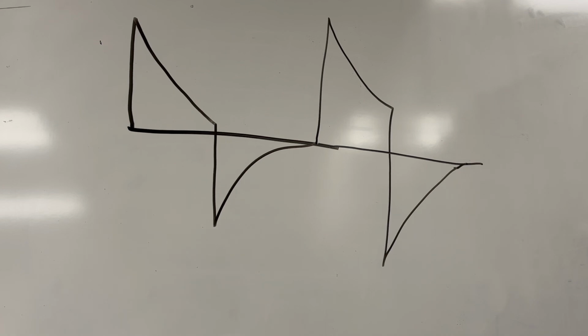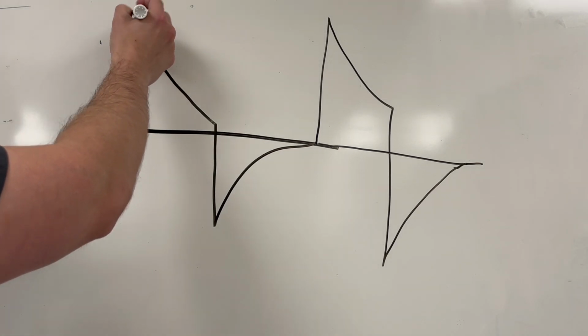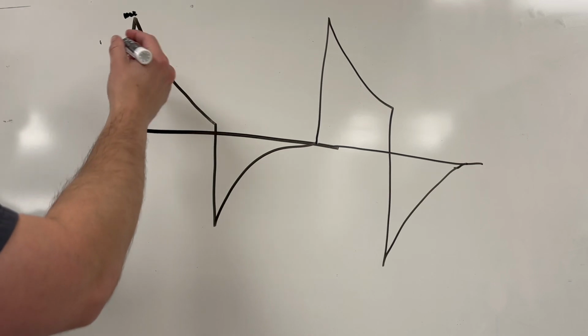When we set an inspiratory cycle off, or end inspiration, we are talking about the spontaneous breaths that the patient may have, so your pressure support breaths. The inspiratory cycle off is at what percentage of our peak inspiratory flow we are going to cycle the breath into exhalation. So it helps control how long the inspiratory phase is for your spontaneous breaths. On this first one we have here, your inspiration starts, we go up to your peak inspiration. So if we look at this like this is 0 and this is 100% of that peak inspiratory flow.